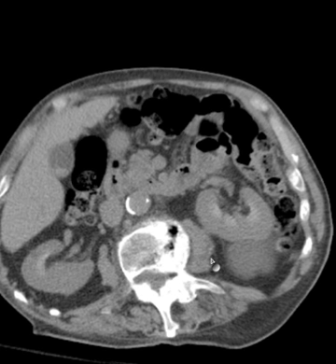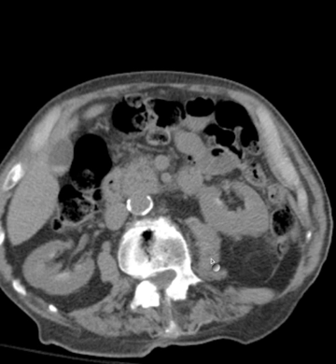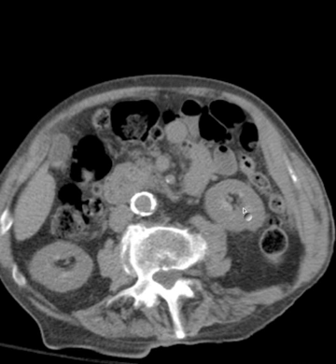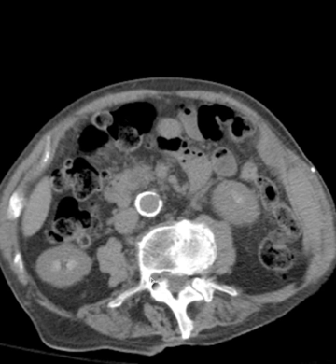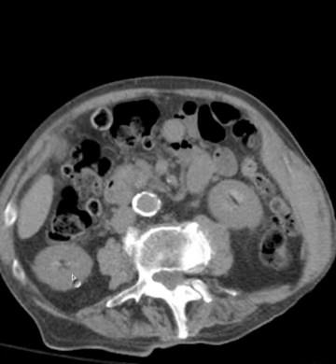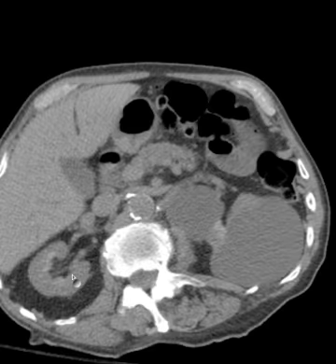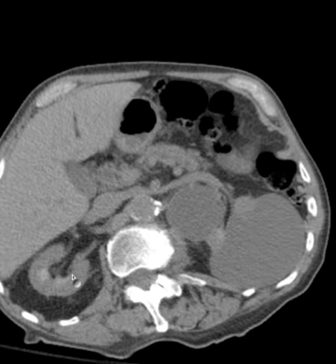But sometimes you also just get high attenuation because of the concentration gradient that the pyramids actually accomplish. Remember how there is an increase in the ionicity, the concentration, as you go from the renal cortex down toward and into the pyramids. So normally you may see some degree of higher attenuation in the region of the renal pyramids. In this case, it's more pronounced. It may also be early nephrocalcinosis, medullary nephrocalcinosis involving the pyramids and portions of the renal medulla.